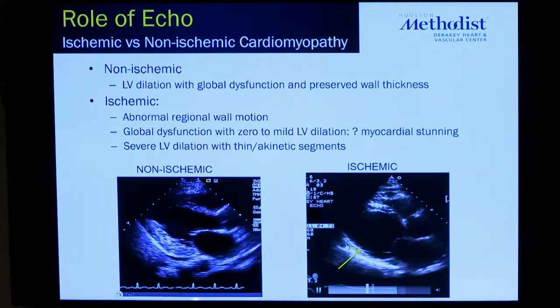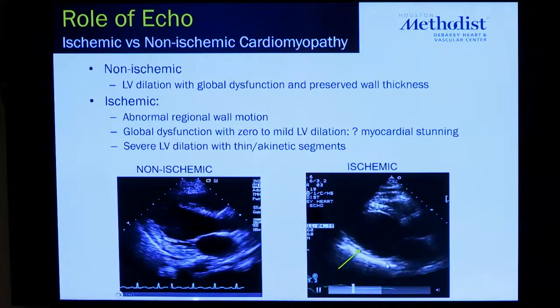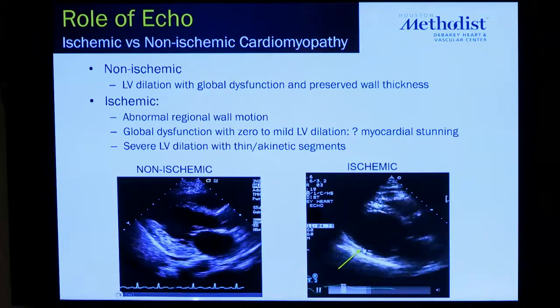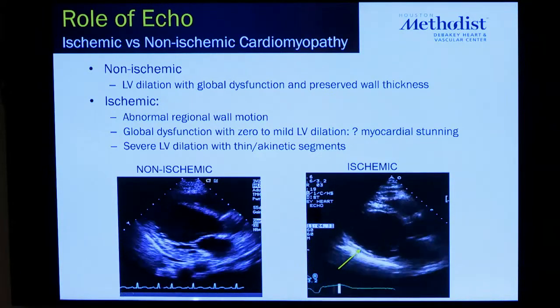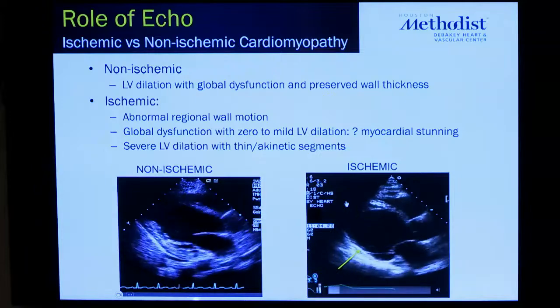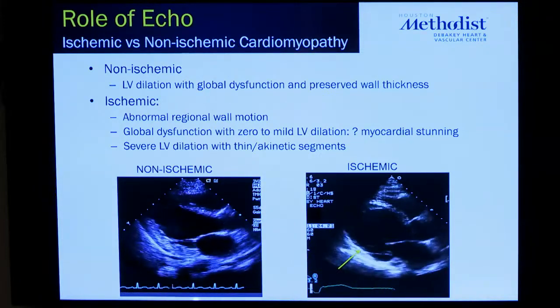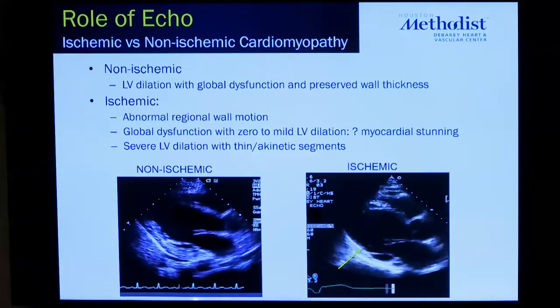So until proven otherwise, this is coronary artery disease with probably a previous inferior infarction. However, there are some non-ischemic cardiomyopathies that can also have regional wall motion abnormalities. Now, if this patient has known CAD or a good history of an MI, you put the two together, and I think the chances then are extremely high that you're dealing with an ischemic cardiomyopathy.